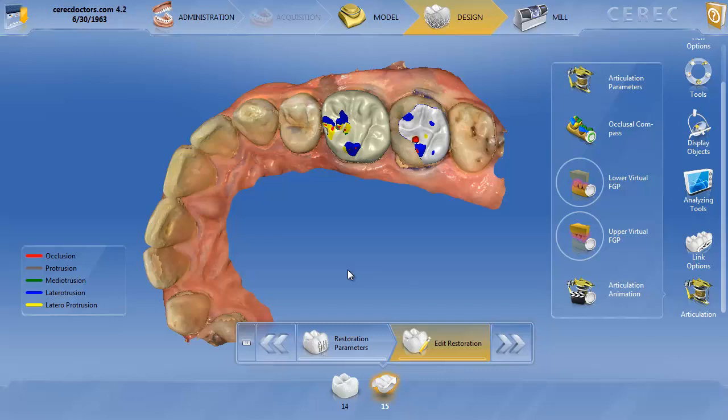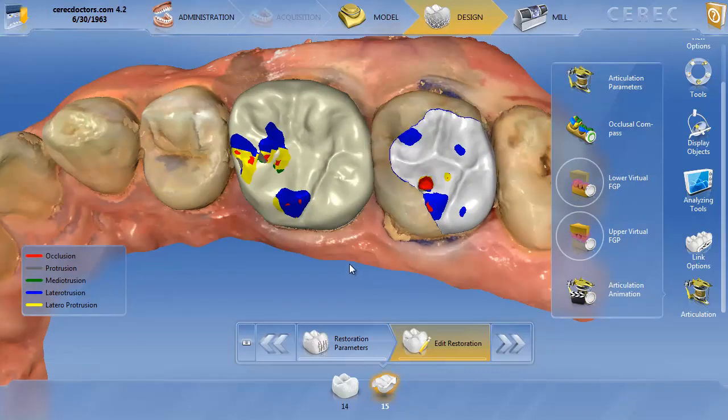And the other one would be, for instance, if you have not enough information and you have the software calculate these with the initial proposal. So like I said in an earlier video, I prefer not to have these marks taken out in the initial proposal. I like to see these marks and then just adjust them manually. That's just my preference, but it takes away some of the error potential if you just have it do it automatically. In this case, I can actually verify to make sure that those are actually interferences that are there and some mistake was not being made.